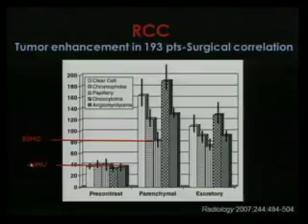More or less, they are around 40 Hounsfield units. When we put contrast, and this is important to see, the tumor that gets less contrast is the papillary type. But it goes to 80, which means we have at least 40 Hounsfield units of difference between pre and post, which means the problem of pseudo-enhancement is usually not common in renal cell tumors.